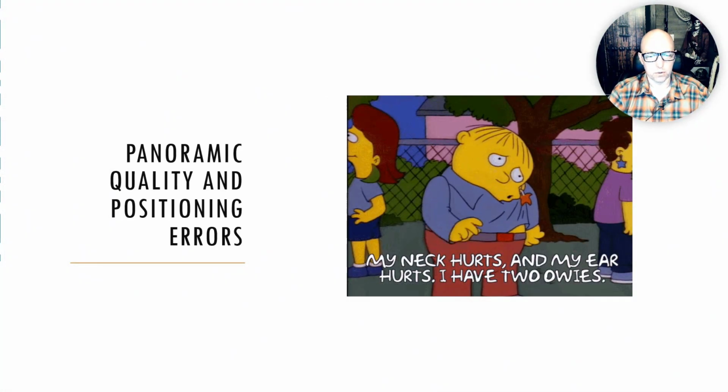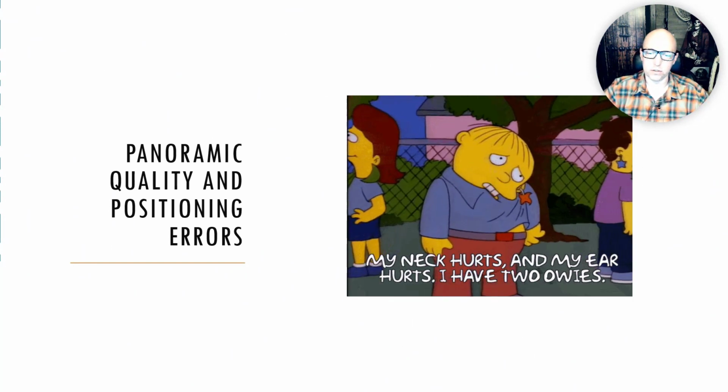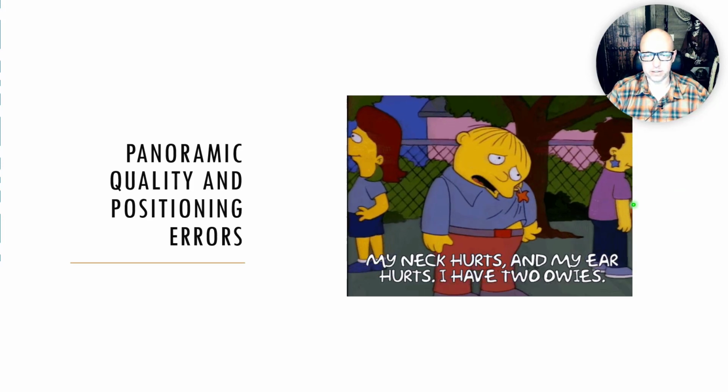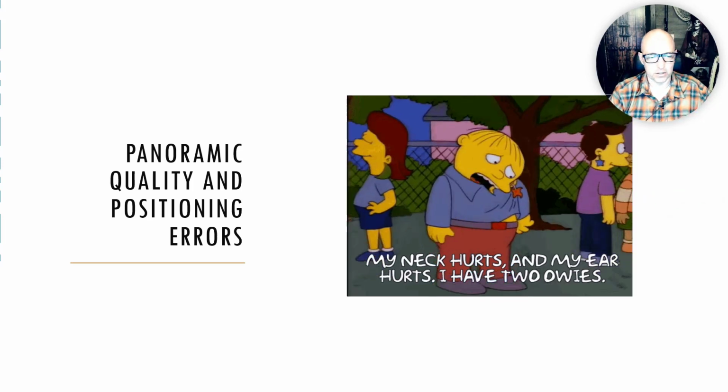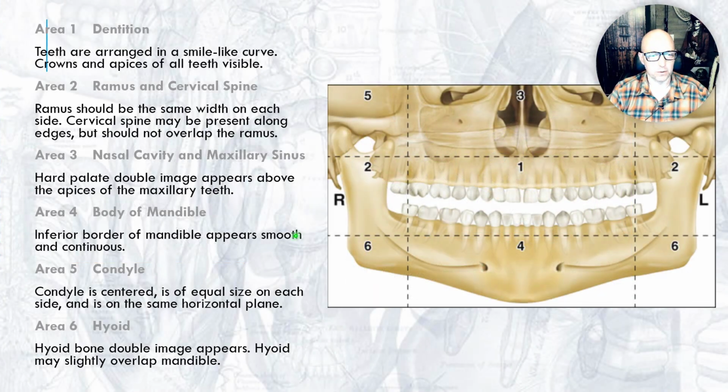Now we're going to get to quality and positioning errors. Sometimes I see patients positioned where they must have been like this in the pano machine. They're so distorted. It makes my eyes hurt to look at those types of radiographs. So we're going to avoid that.